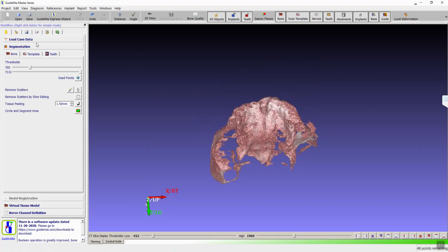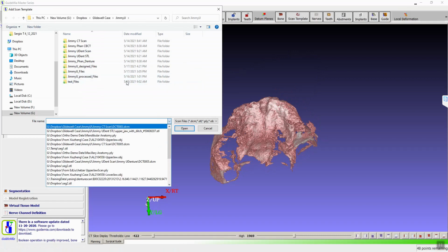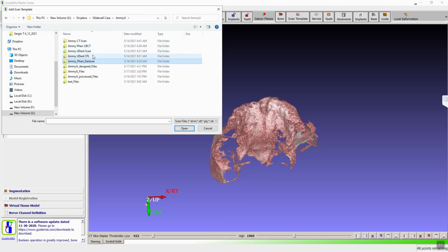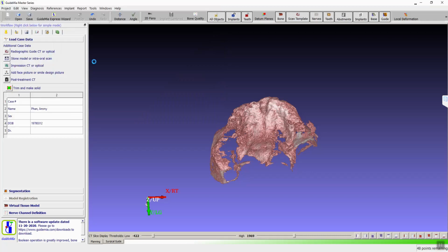Then we will load the radiographic guide. But our markers are gone, or are they? Well, the markers are there. They're not in the bone model, but for registration purposes, we have them. So we're loading. I was afraid to segment it before importing the guide. No worry, the markers are really there. We take this range and we know the markers are there. We're doing the registration now.